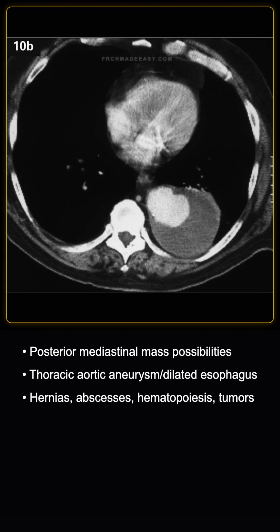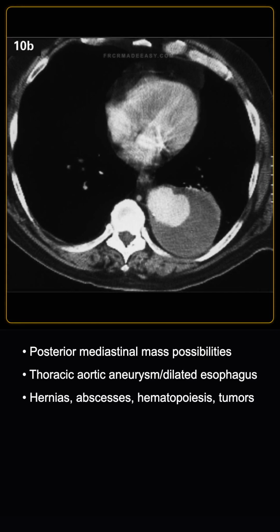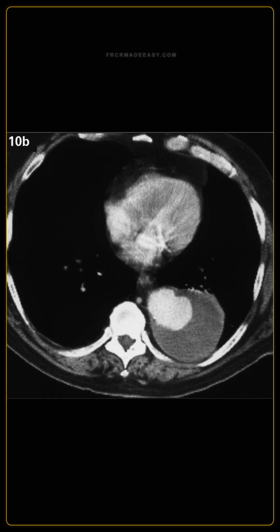Other causes are hernias like a hiatus or Bochdalek's hernia, spinal abscesses, extramedullary hematopoiesis, and neurogenic tumors. I am displaying an axial contrast-enhanced CT image of the chest.